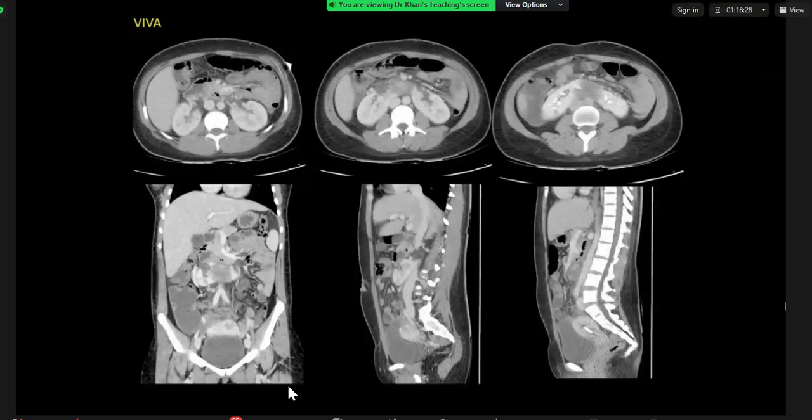All right. So the isthmus of the horseshoe kidney is non-enhancing. I cannot see evidence of stones, back pressure, or any masses. Okay, I'll stop you there.